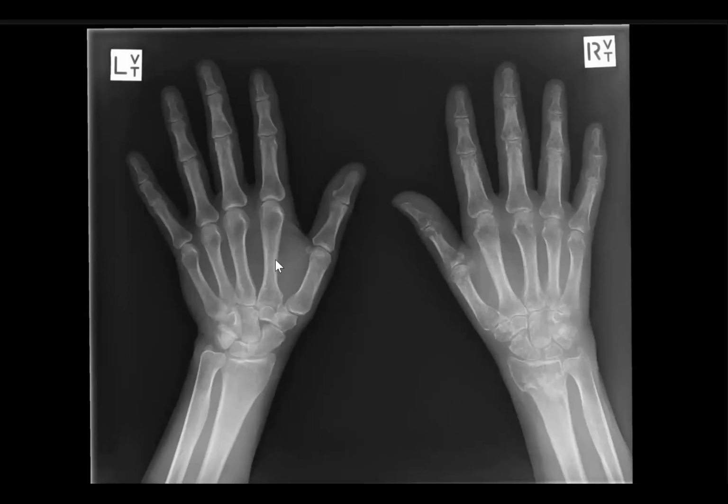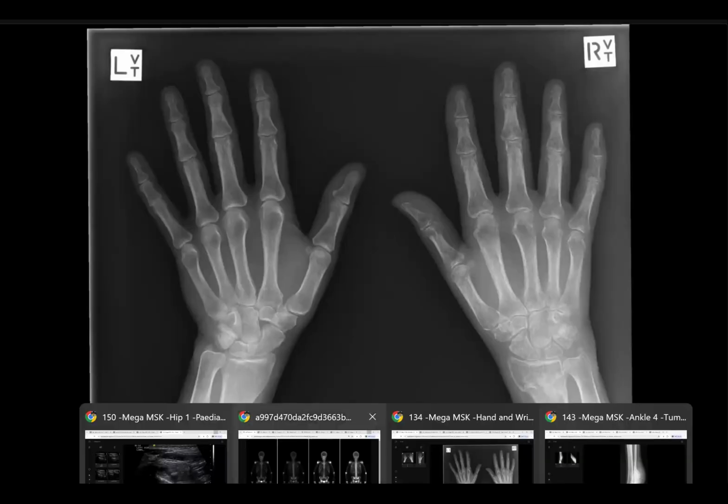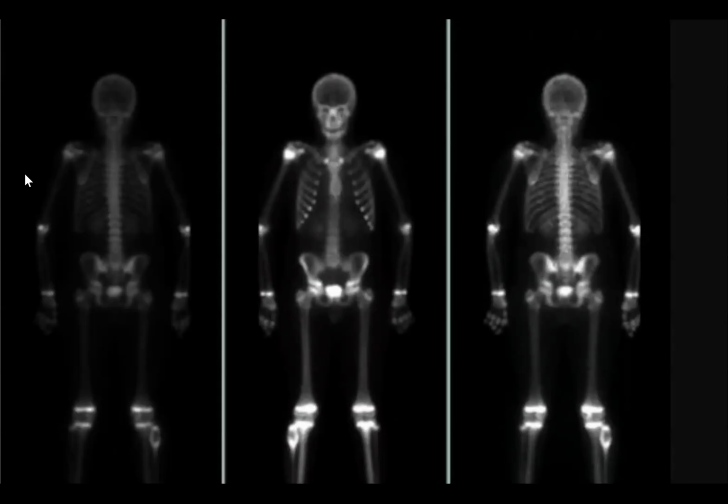In the metacarpal bones, we have a waist, a reduced caliber in the central part. And usually, we have a very thick cortex in the metacarpals. If we measure both cortices, it will equal the medullary cavity. Unlike this case, the waist of the bone is lost, with broadening of the medullary cavity, and the cortex becomes very thin with trabecular prominence. It's a case of thalassemia. And if unifocal, it may be a case of enchondroma.